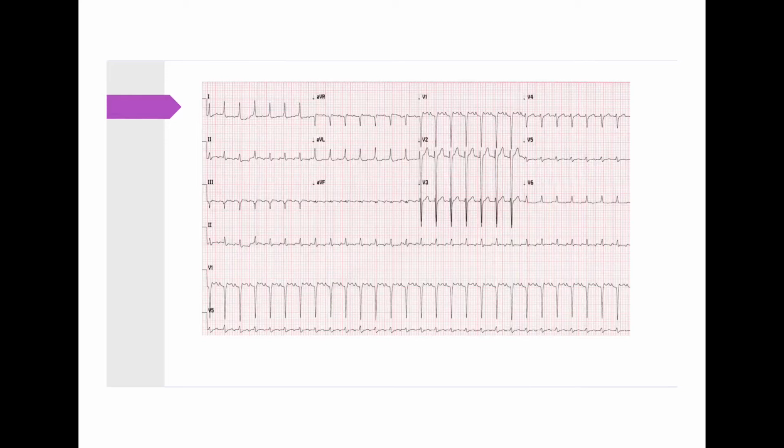This is also a patient with atrial flutter, although it's a little more difficult to recognize. In this case, you don't really see the clear sawtooth pattern in lead 2, but in V1, which is the other lead where you can look for atrial activity, you'll see a blip here, a blip here, a blip here, a blip here. And again, these blips are occurring one big box apart, 300 times a minute. The sinus node can't fire that fast, so it's not sinus tachycardia, and it's more consistent with atrial flutter. And so these are called F waves with a capital F.